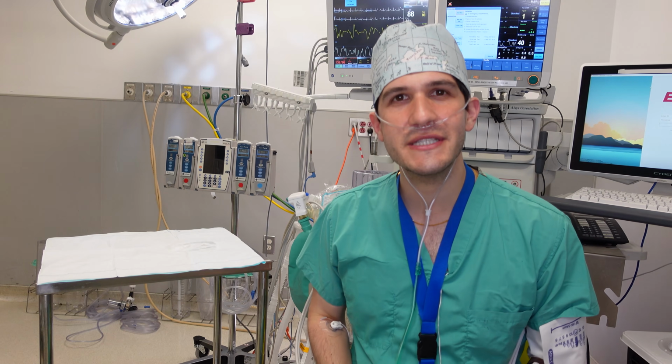In this video, I'm going to be talking about the basic monitoring equipment that's used in anesthesiology.